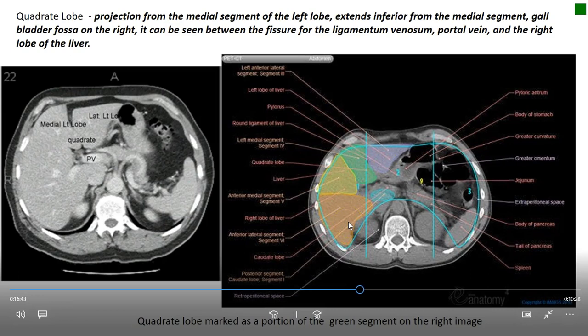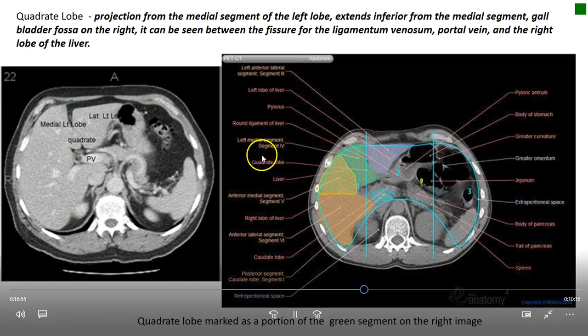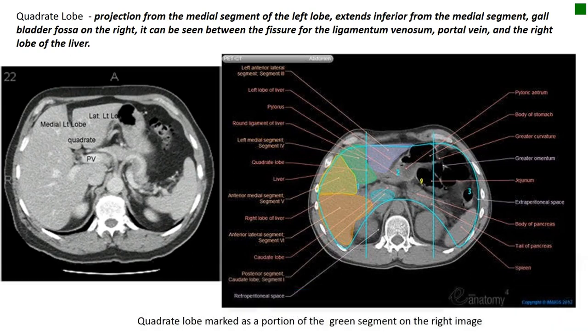As you scroll through, you would be able to see the different segments. But the last time we tried to access that, it was unavailable, and we have put in requests to the library. I think now what I have seen is that the labels on the side are labeled in different colors so that you can get that same idea, but it's not quite as nice as having the structures outlined here.